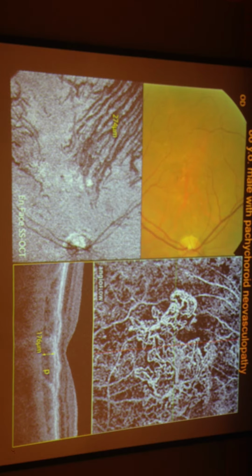But if you do a fluorescein angiogram and you don't see any leakage, would you feel comfortable to treat them?